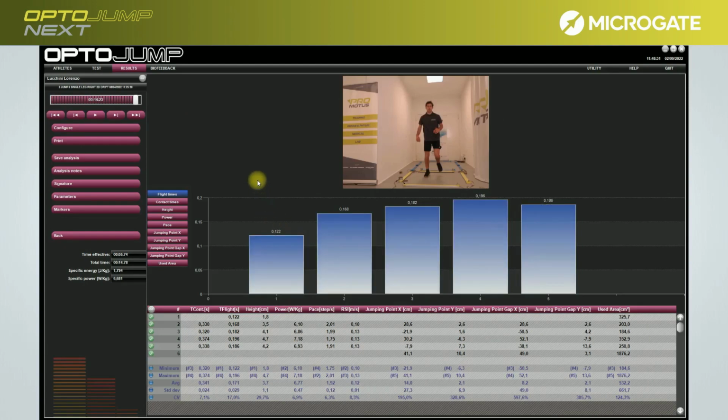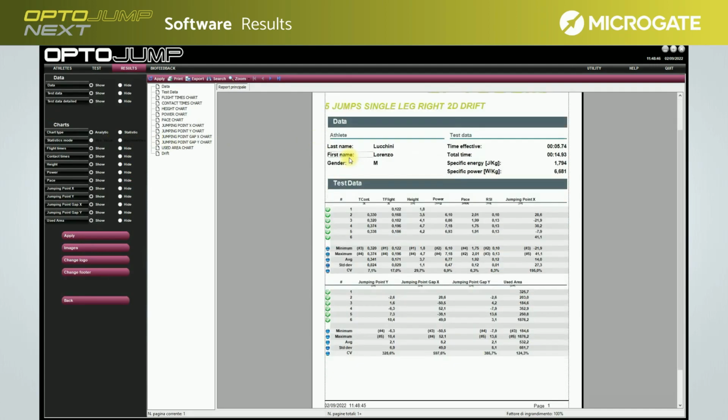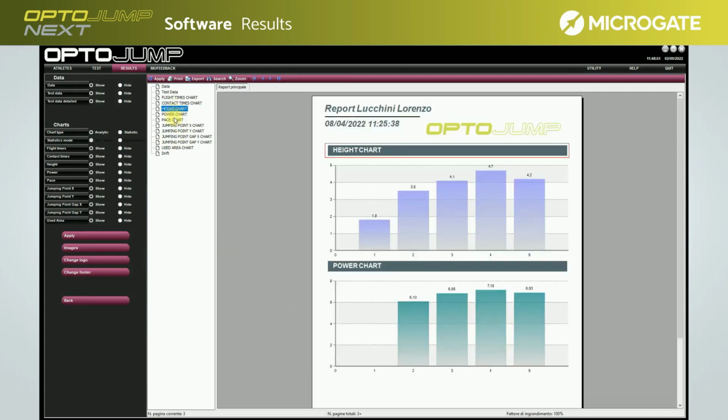At the end of the analysis of the results, the software gives the possibility to display the data by printing dedicated reports. On the screen of the selected test, the print button displays a preview of the reports with all the data corresponding to the test in different formats and graphics. Report, which differs by test type, will be explained in detail in the next chapter.